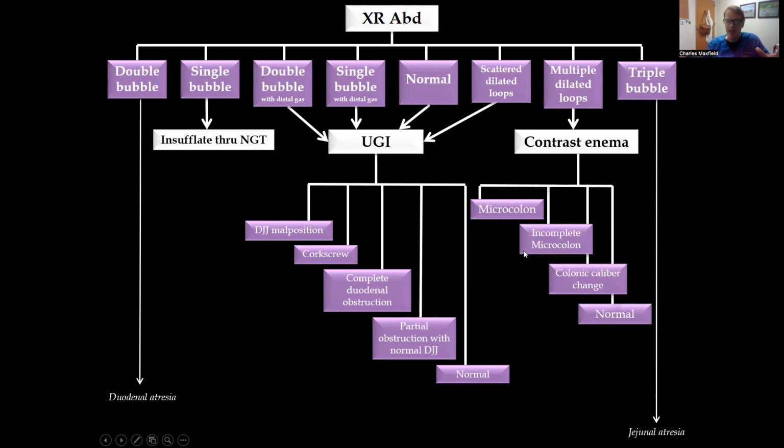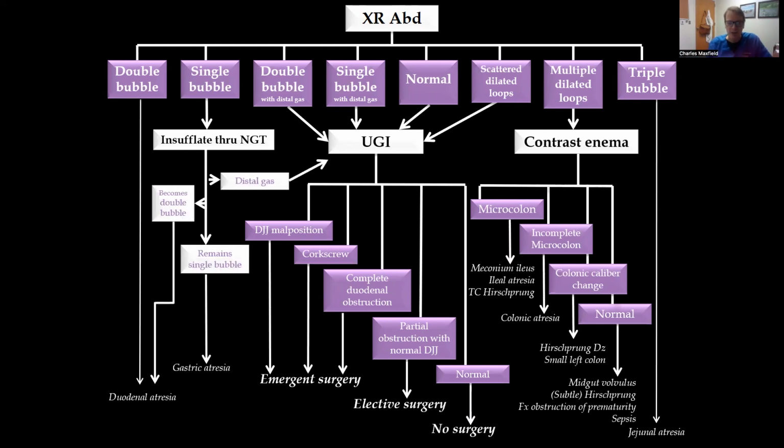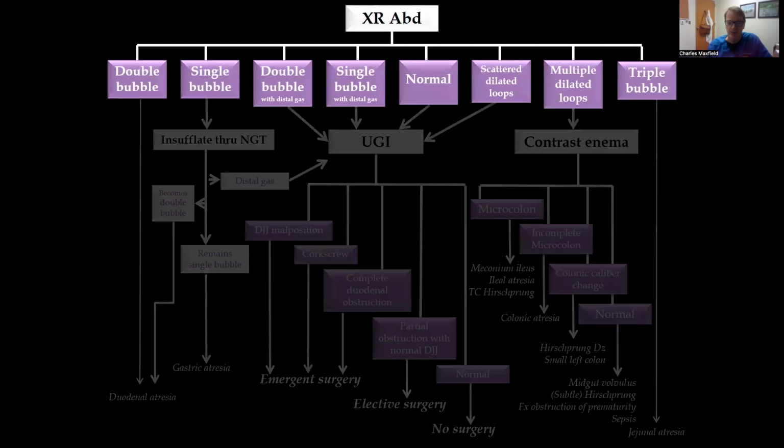So this is a pattern-based approach: as long as you see an X-ray or a contrast study and you can assign the best match to it, you can then manage these patients. And before you know it, you have an algorithm to manage these patients that right now looks probably ridiculously complex and intimidating to you. But by the end of this talk, we'll work our way through these, and I bet you'll be making some of these diagnoses with me, okay?